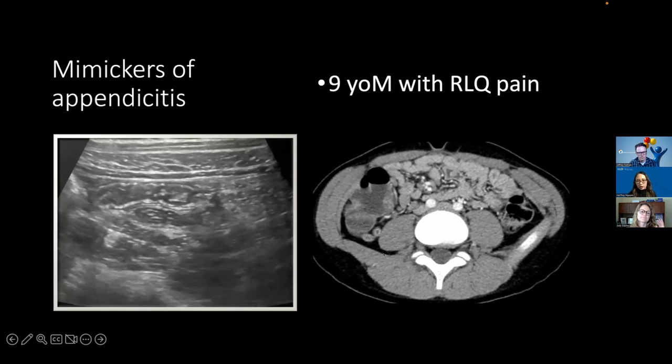The child ended up having a CT to follow up. Luckily, there was a little bit of fat in the mesentery, so you know there was no appendiceal fat stranding, so no acute appendicitis per se. But the mucosa is very thickened and hyperemic, likely secondary to inflammation related to the pinworms. Those little echogenic guys ended up being pinworms, confirmed on rectal exam.